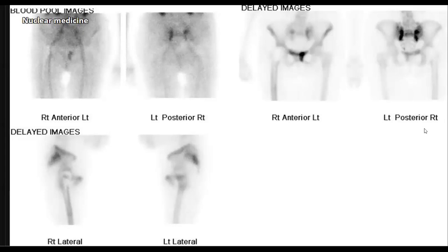So in that case, you are worried about what? The Honda sign denotes that this patient has which type of lesion? What do you think? Yes, it is typical for sacral insufficiency fracture. Bravo. Excellent. So in this patient, the examiner will be happy if they hear that you are confident to say that this patient doesn't have any malignancy in this image. He has just a sacral insufficiency fracture.